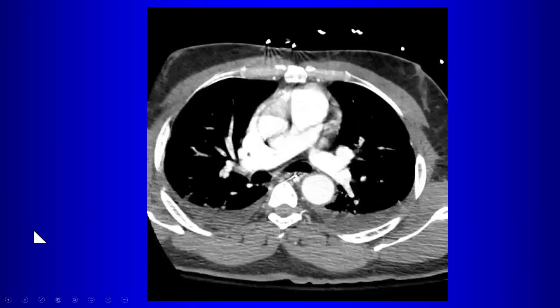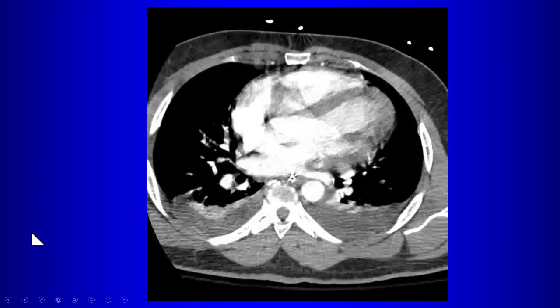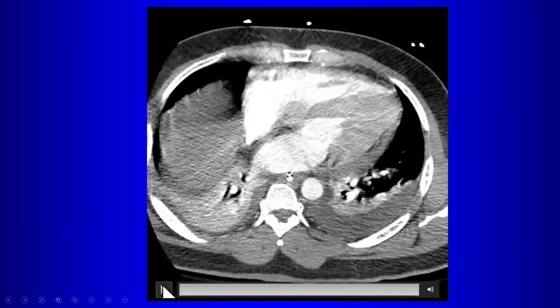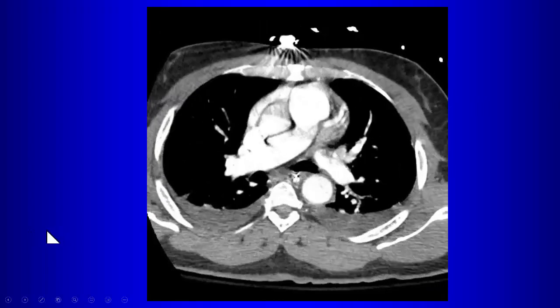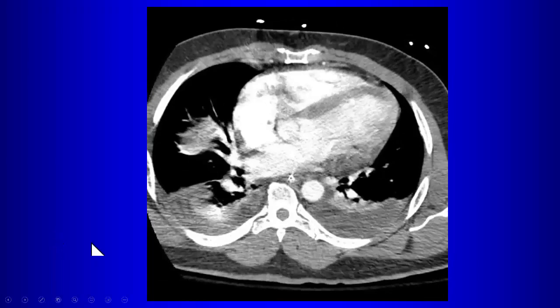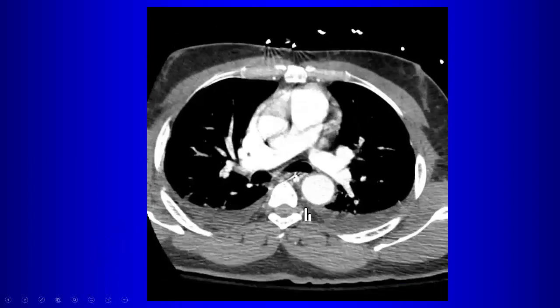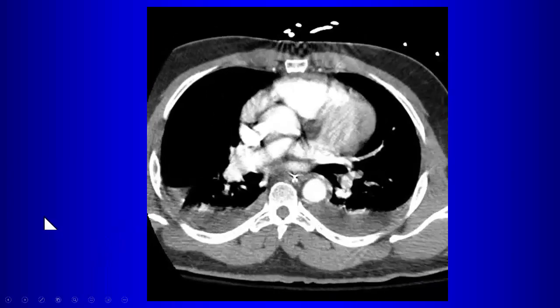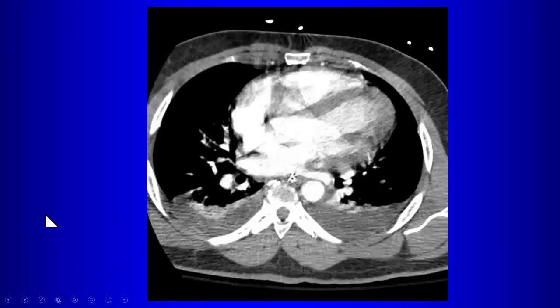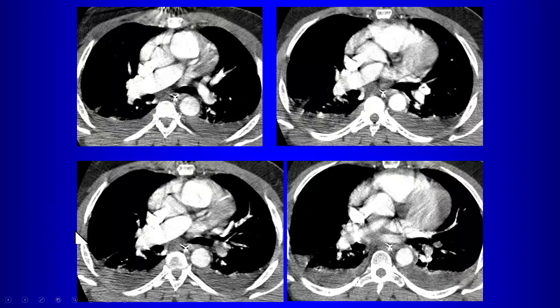Well, you can have a PE right in the interlobar artery, but you're right, PEs typically can go across a branch point. I mean, the direction of the filling defect is streaky. So real PEs, real clots tend to be lower in attenuation. This one, rather than a well-defined central filling defect, it almost looks like somebody is pulling a shade over the vessel. You see what I mean as you scroll down? It looks like somebody's pulling a shade over the vessel. So that's typical of an artifact. And so these guys here.